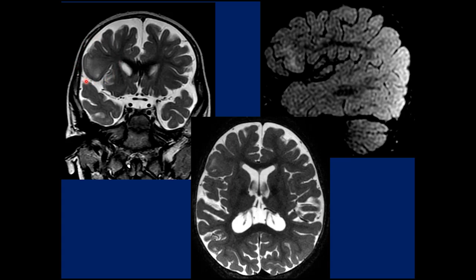So if I want to remove it, what are the surgical limits of my resection? Inferiorly, sylvian fissure. Inferomedially, upper surface of the insula. Superiorly is this sulcus. This is approximately 2.5 to 3 centimeters above, away from the sylvian fissure.